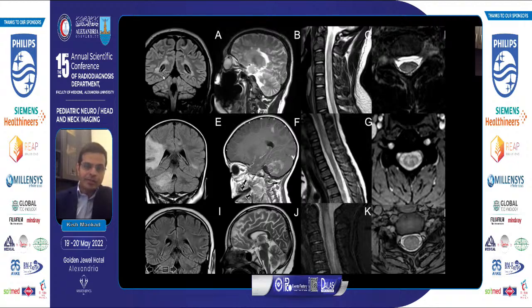If you have lesions that are periventricular, deep white matter lesions, discrete lesions, typically looking like MS, you may have spinal cord lesions as well. And the spinal cord lesions are very commonly eccentric, but these lesions are not confluent. They are different and discrete lesions. This is multiple sclerosis on radiological phenotyping. Of course, you have to think about other things as well, like, what is the contrast doing, etc.